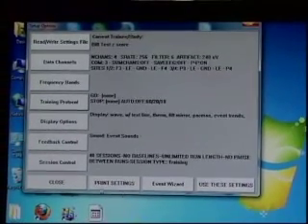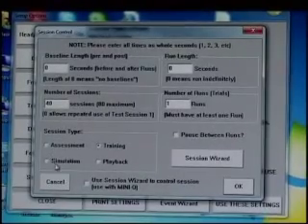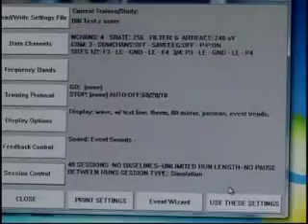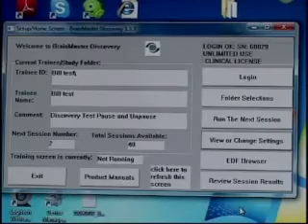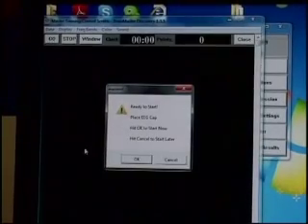Now at this point, because of this exercise, I'd like to make this a simulation because again we don't have a client actually hooked up. So we hit OK. Let's go use these settings and let's take a look at what we have. Go run the next session. This is the first time we're running z-scores on this computer, so notice what's going to happen. We're going to hit go.